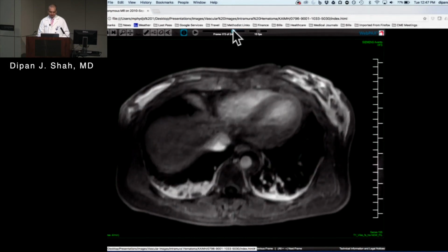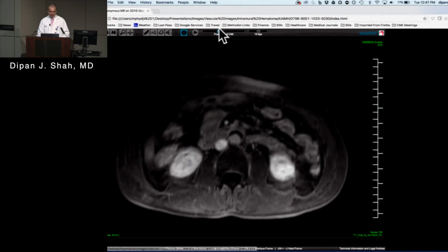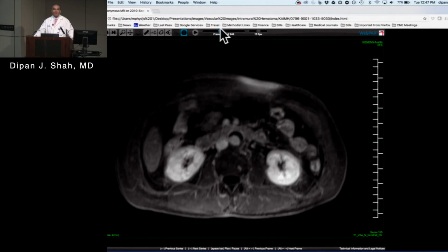Yes, that's right. For an intramural hematoma, that's one hell of an extension. I mean, these usually are kind of localized in the area. So the one thing that favors dissection is the extent of it. Okay. But we don't see a tear. Right. That favors. Right. Yeah.